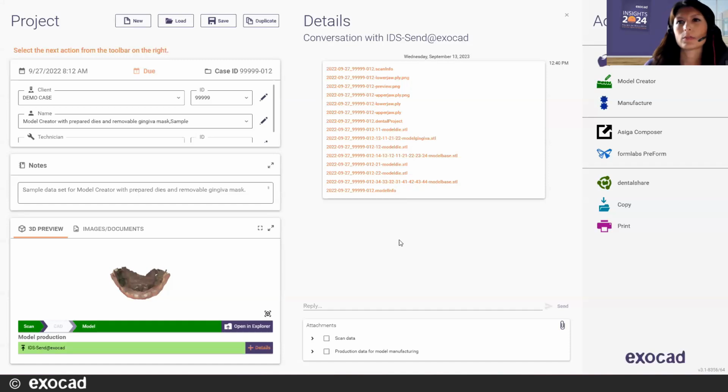Okay, we have another question, Lucas. When designing a single tooth, the simple menu isn't available in tooth positioning. When instead you design the bridge and you set up just a single tooth, you need to go to advanced tool. Yeah, they're probably talking about getting to instant anatomic morphing and those type of tools.